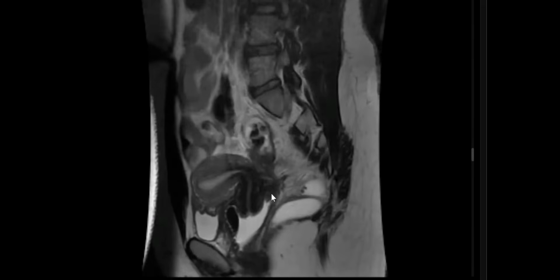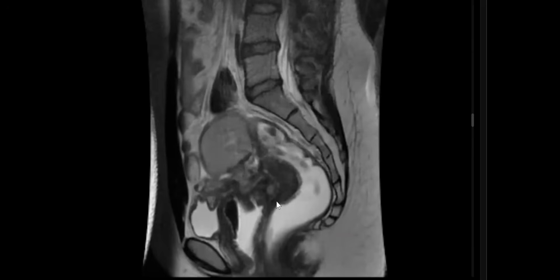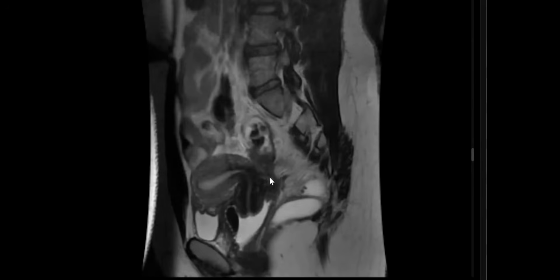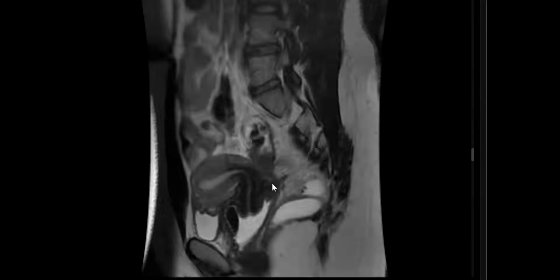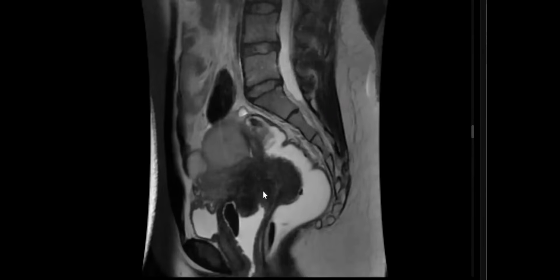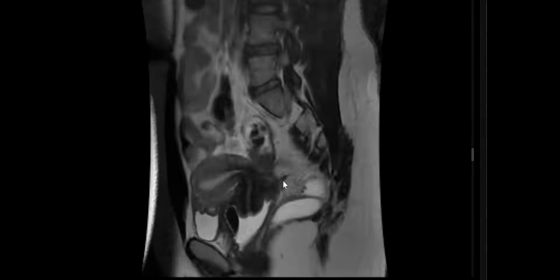You see, this is a posterior fornix. This is the cause of dyspareunia in this patient. It's a common underdiagnosed case. You see, I need to inject fluid or gel inside the vagina and inside the rectum. It affects the anterior rectal wall, causing a serrated appearance seen on contrast enema, and it is continuous along the posterior vaginal fornix. It's very important to mention this relation because if we do a laparoscopy, it may end in fistulous formation. So mapping is very important before any laparoscopy.